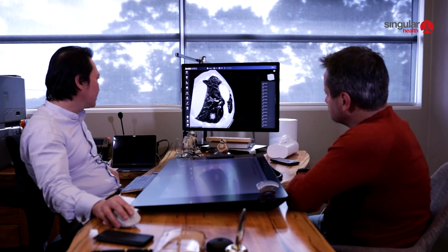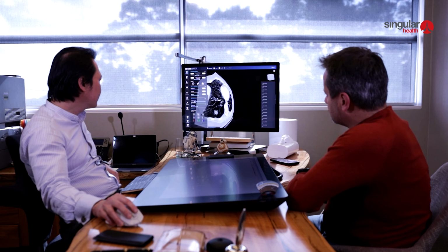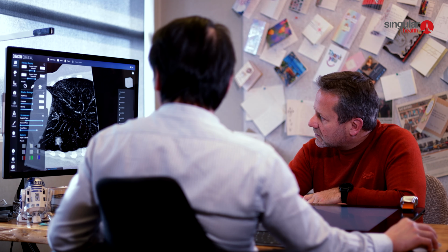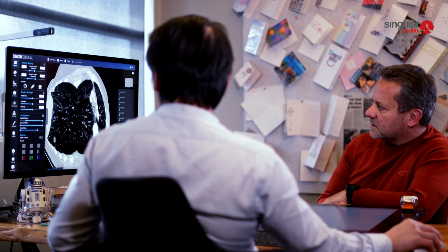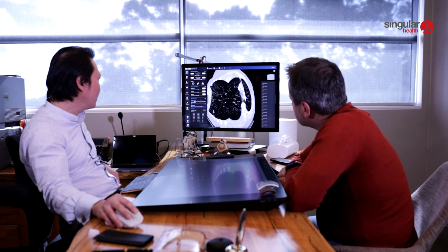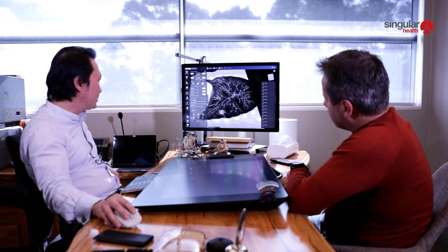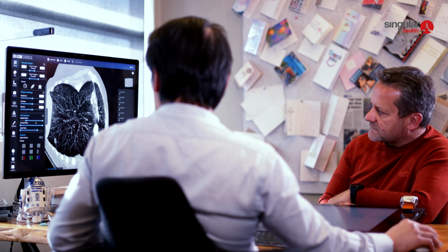Let's zoom out a little bit so then we can show you the rest of the lung. So as you can see, as we go through the lung, there's no other lesion there. Wow, okay. So we can look from here. Can we make that a little brighter, maybe? Yeah, we can. Okay. There you go. Terrific. So this is the lesion that we're looking at. And obviously we look at the rest of the lung here for whether there's any other lesions.